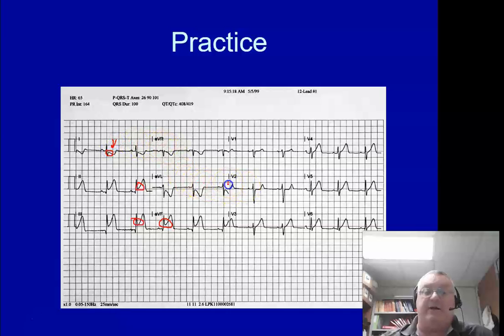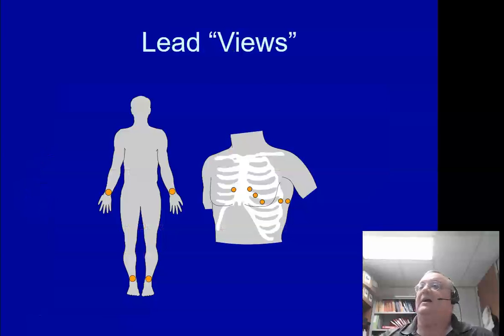Matter of fact, I'll be honest with you guys. The way I kind of do it is I say, hey, it's a depression, okay? So again, I got an inferior lead, an inferior lead, I got an inferior lead. Hey, guess what? Yep, this guy's having a heart attack. Let's get him to the hospital.